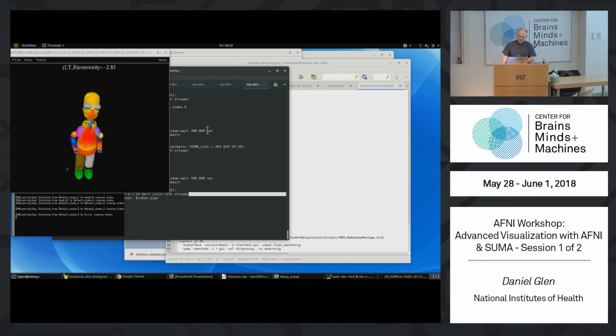So a lot of examples are in there. Your SUMA's not starting with this? Because I didn't edit @do examples last night, so should. You do comma and period, so you can start SUMA any place, and it's got these kind of built-in surfaces.